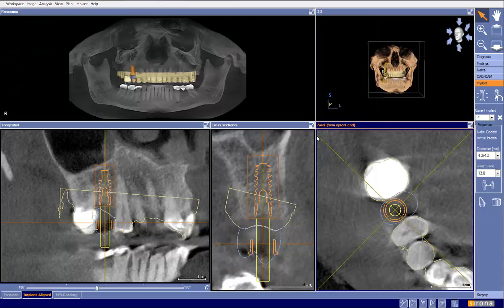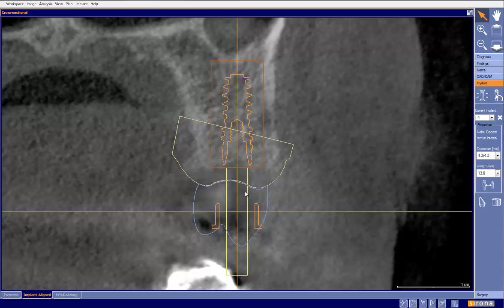And then again from here, we can also see, if I got my drawing tool out here, that we want the implant to come through here. Again, assuming that this implant plan, the CEREC design, is done correctly. We want that implant to actually be coming out through about right here.